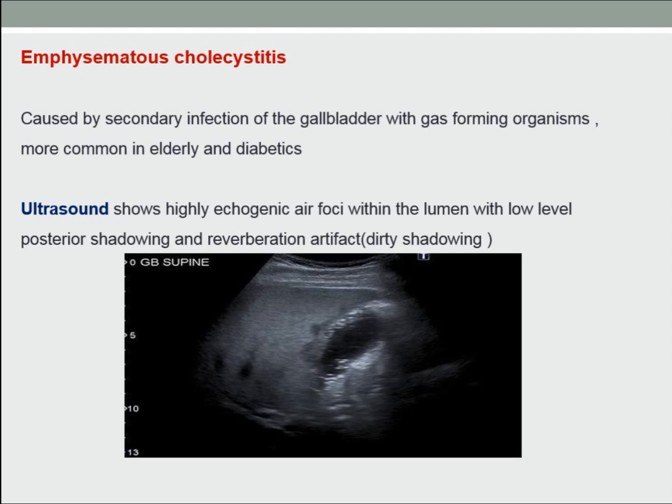Champagne sign. Air bubbles in the champagne go up, like gaseous drinks, soda, and something like that. The bubbles go up. Okay.